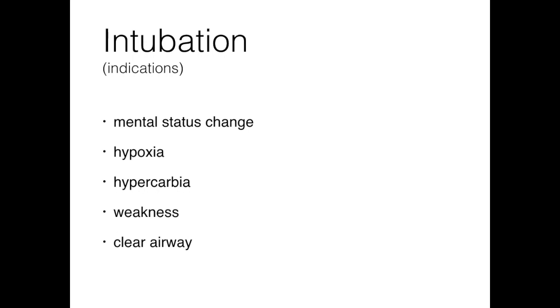airway. The most widely used route is oral tracheal, in which the endotracheal tube is passed through the mouth and vocal cords into the trachea. The nasotracheal route can also be used.